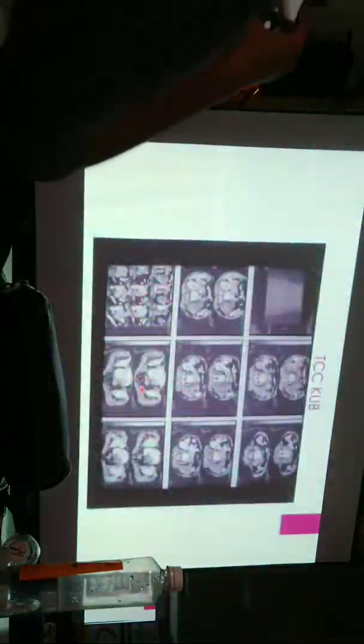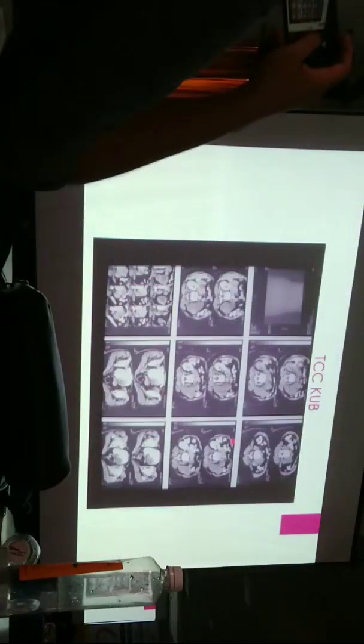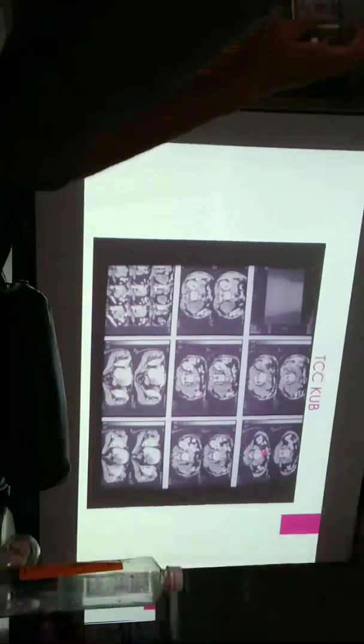So then moving on to some other lesions, transitional cell carcinoma can commonly occur in the renal pelvis.